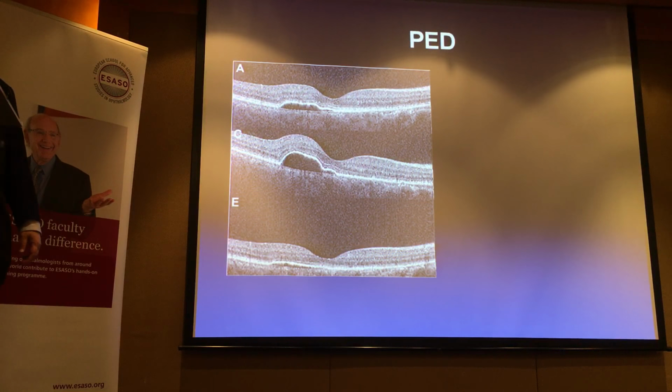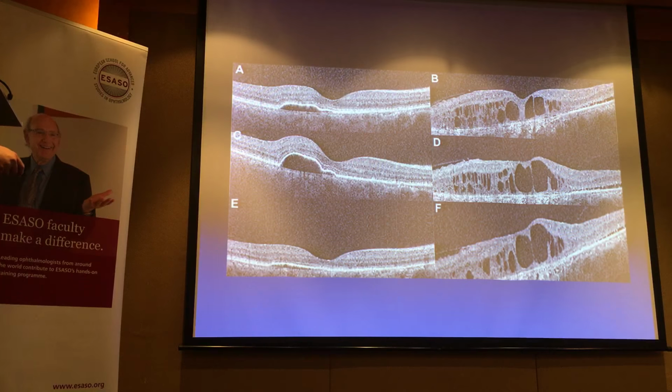So what do I mean? So this is a PED. We all agree, right? Okay, so it's hypo-reflective. This is quite different.